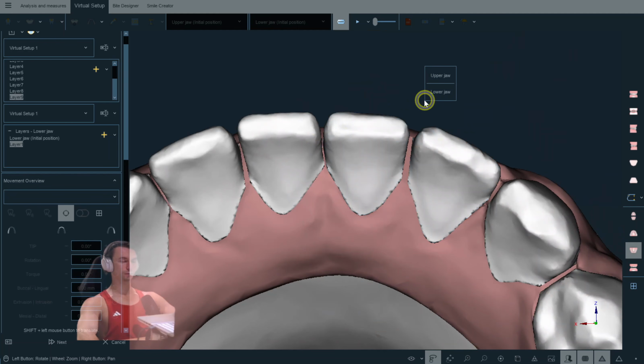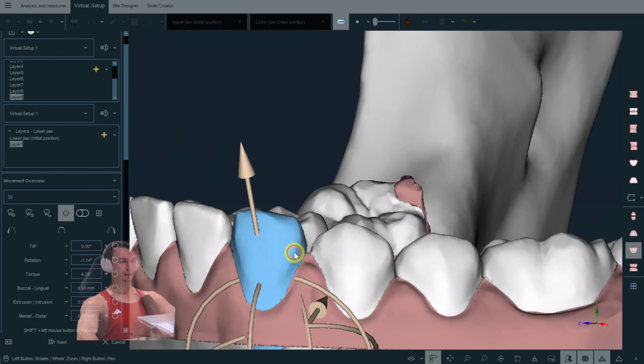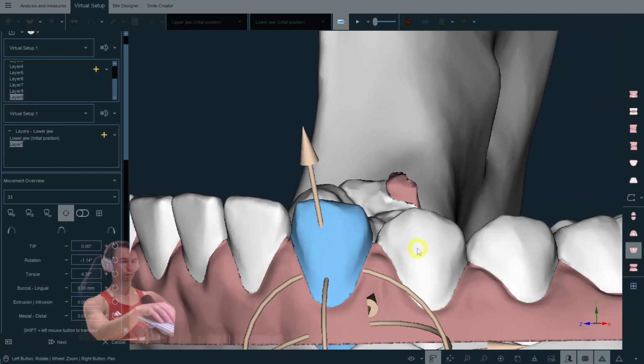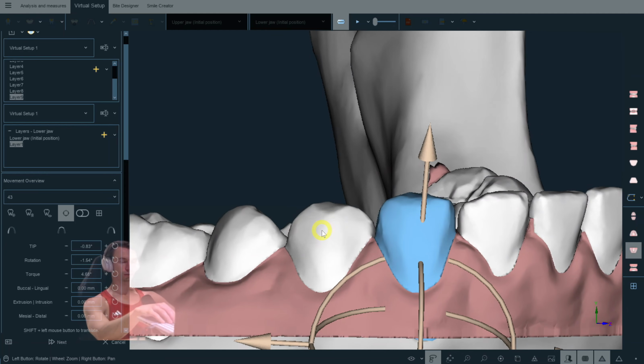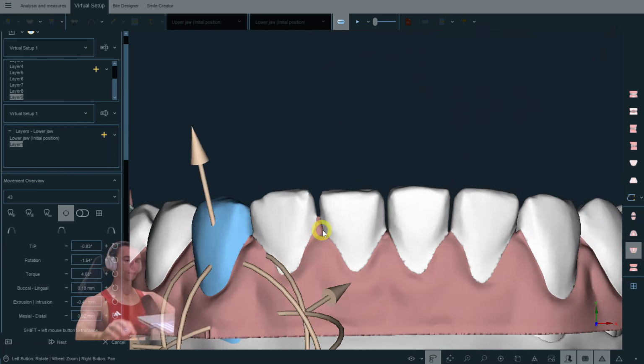I do the round tripping, and I think we can work with the occlusal plane and do some intrusion of the canines. We cannot intrude the canines and the incisors at the same layer, so we'll intrude the canines as much as we can in layer 1.